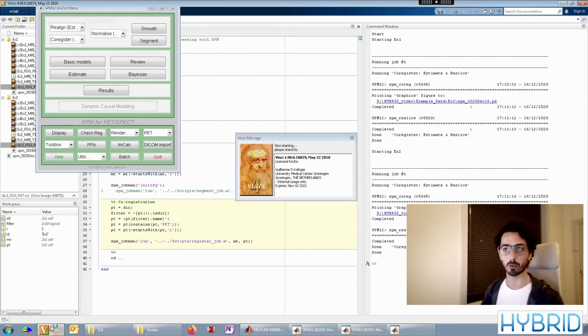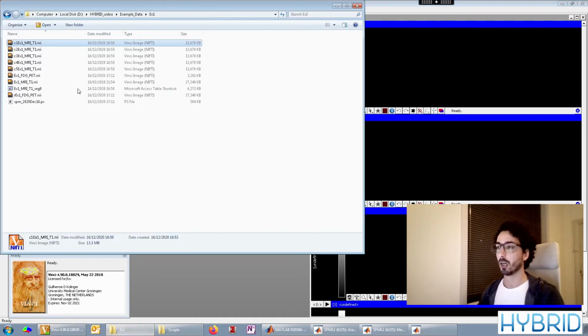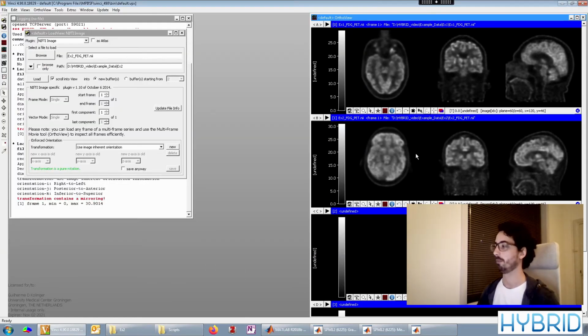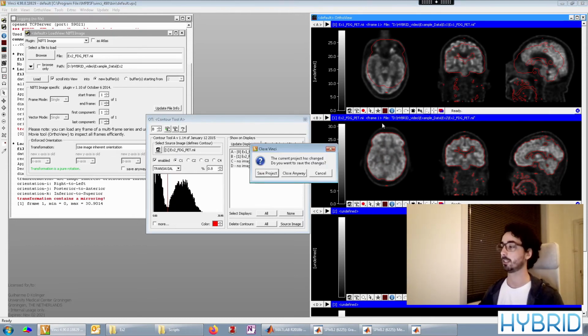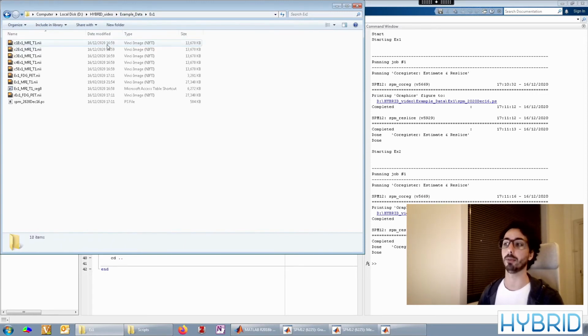So suppose we want to compare voxel by voxel, pixel by pixel, the PET, for example, or the MRI, it doesn't matter, of one subject against the other subject. Obviously, they are not aligned because they were acquired independently, and this is very clear if I, for example, create this here and project it to the other. Clearly, it's not aligned. So how do we deal with that? It's the spatial normalization. In that way, we're going to have the images aligned to a common space.